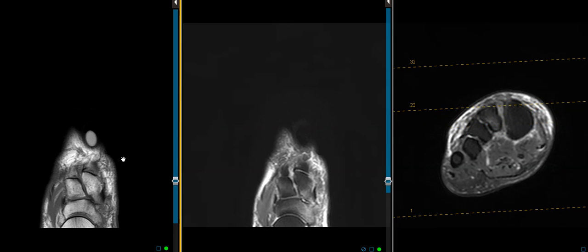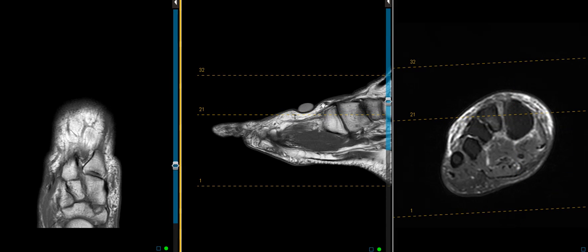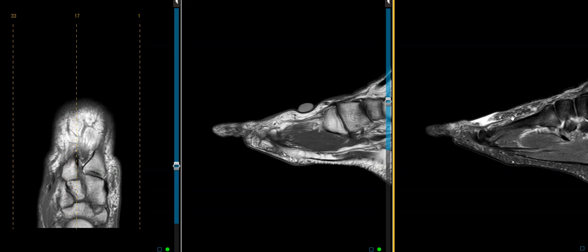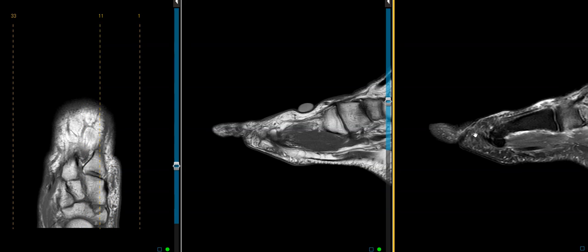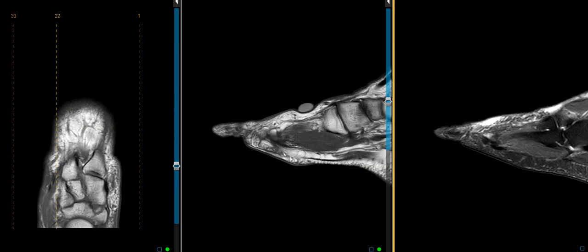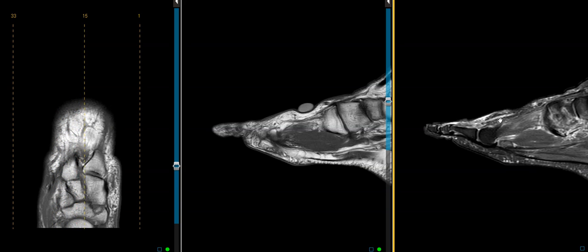Let's see if we can find the markers right here in the dorsal soft tissues, right here the forefoot. And deep to that, she does have some edema in the soft tissues. We'll put up a view here where fluid will show up as bright edema. Here's some brightness over the dorsal surface. This is getting into the great toe there, second toe. You can see all this edema over the top of the foot going in towards the ankle. So soft tissue injury involving the soft tissues for sure.